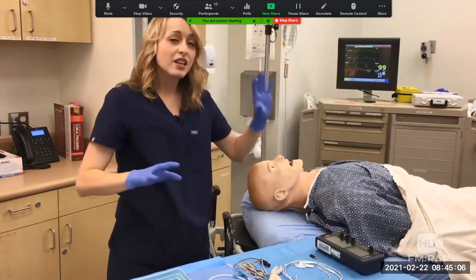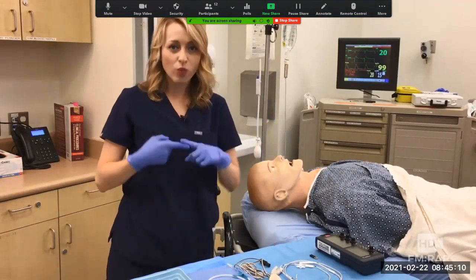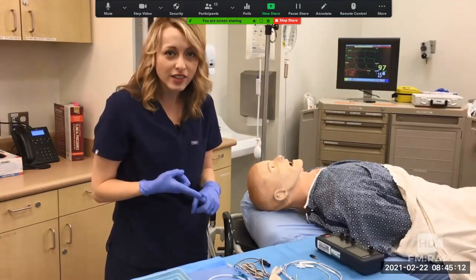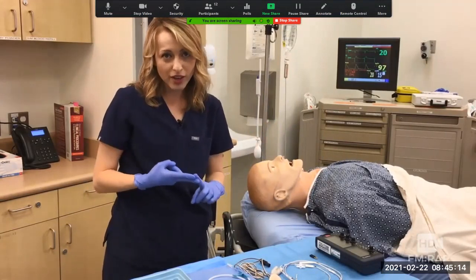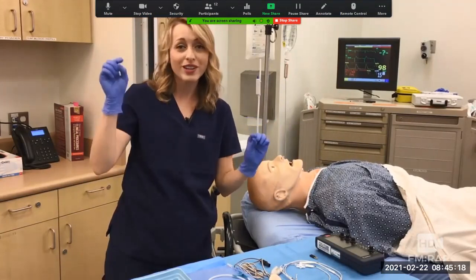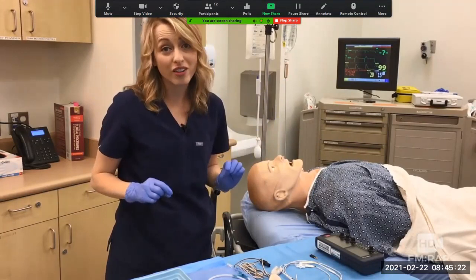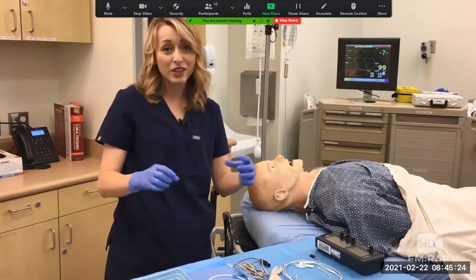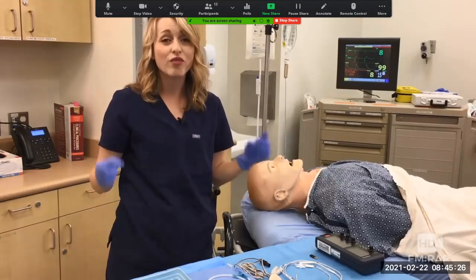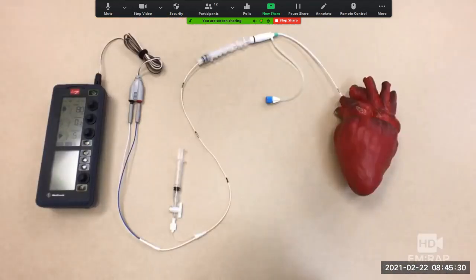Now, the only hard part about this procedure is remembering what gets connected to what, the settings that you're going to put on the pacer generator, and the pattern on the cardiac monitor that we're going to look for to know that we are in the right ventricle for sure. But don't worry, we got your back on all those things. So let's start by looking at a quick schematic overview of what those connections should look like when you're all set up. From the right ventricle, the pacing wire comes out the SVC and through the right IJ, where you placed it.